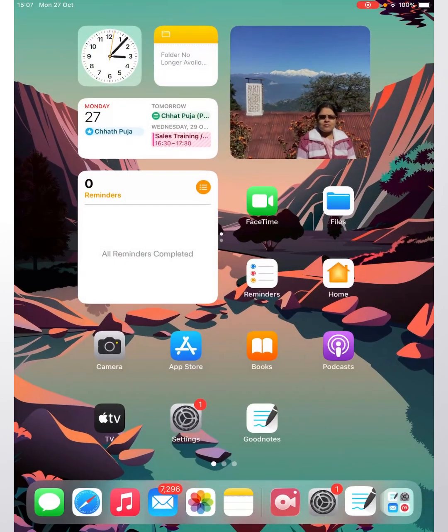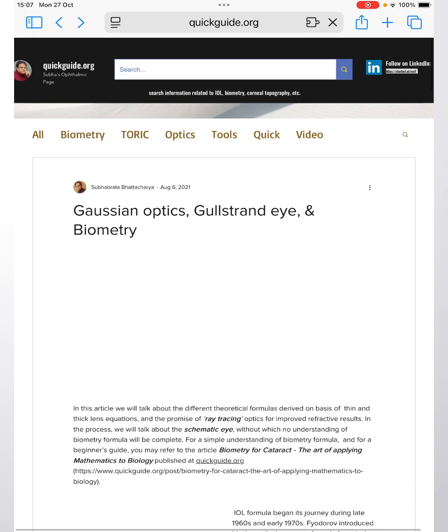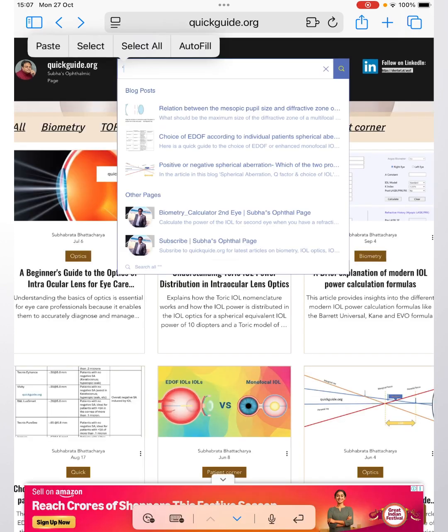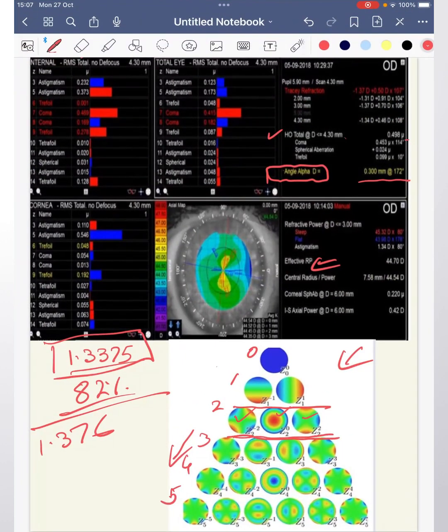Well, you will understand this more if you go into my website and look into this, which actually explains how this total corneal power or the net corneal power is calculated. Now, because for post-LASIK patients their normal cornea anterior posterior ratio is altered, you will find a lot of discrepancy between effective real power values and the simulated keratometry values over here.